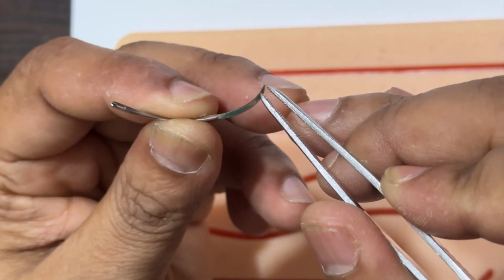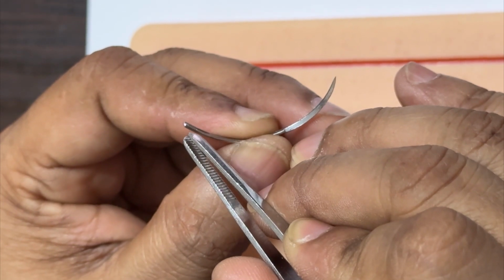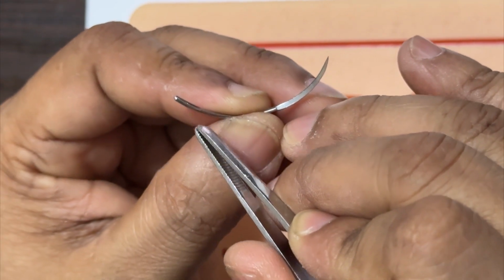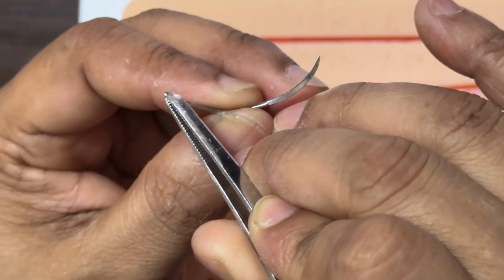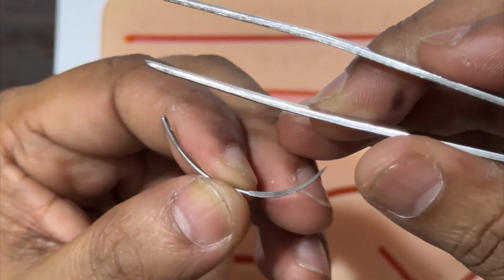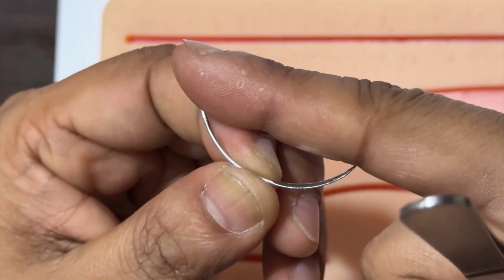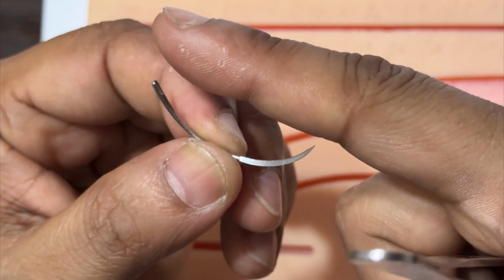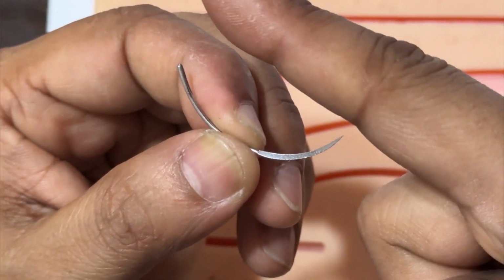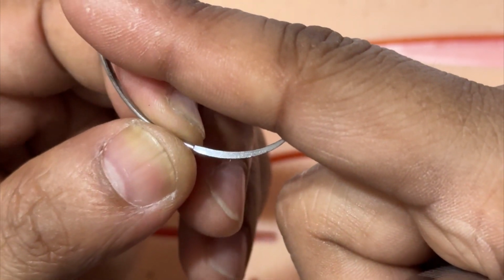The distance from the tip or the point of the needle to the eye or the swage of the needle, but not along the body of the needle, is called the chord length. Now look here, I'm showing this portion, from this portion to this portion, the straight one. This is called the chord length. This is not the longest length, okay? This is a small length, but not the smallest length either. Remember this one. Understood?